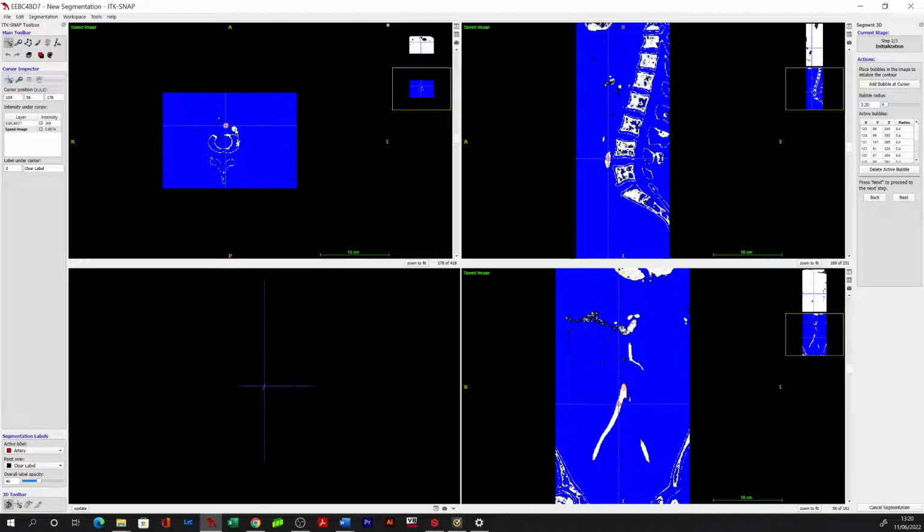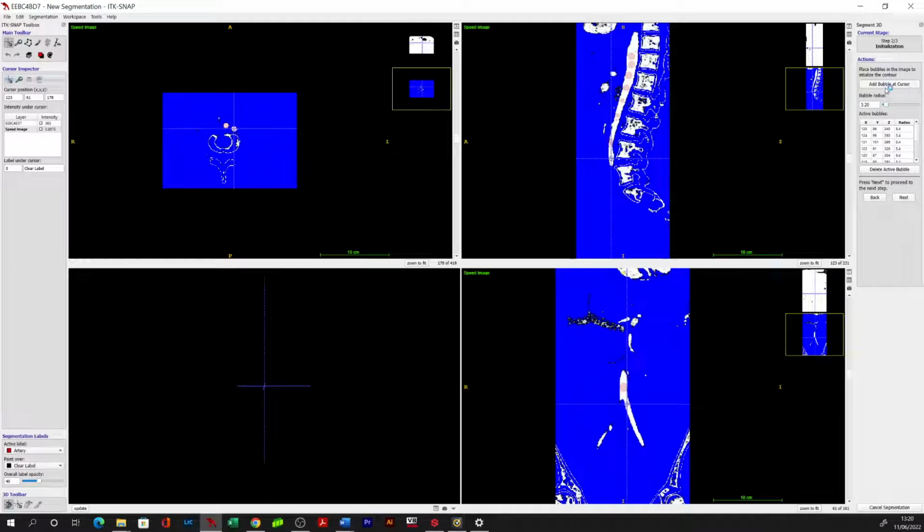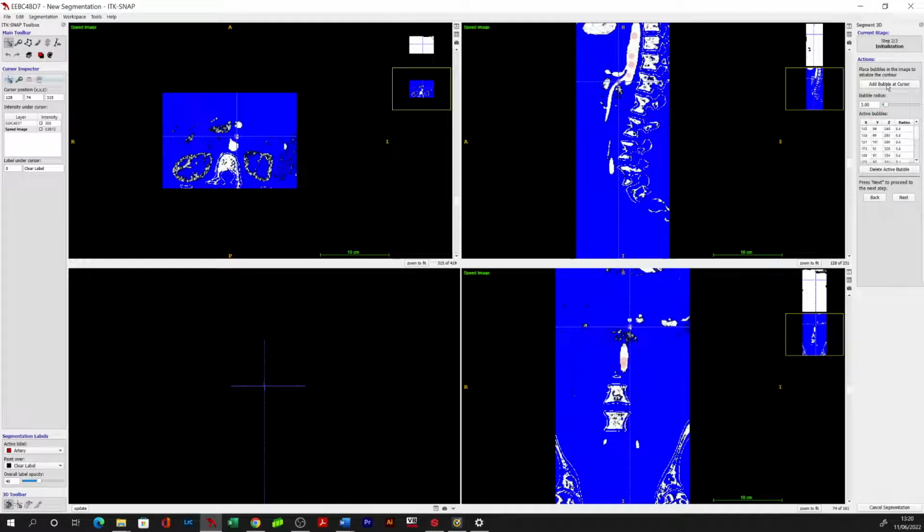And you may need to reduce these. The more labels you add, the more intense this is going to be on your computer. So again, if you've got a lower performance PC, this may not necessarily work as well as you might hope. Okay, so once we've set a bunch of things, we can go to the update option.